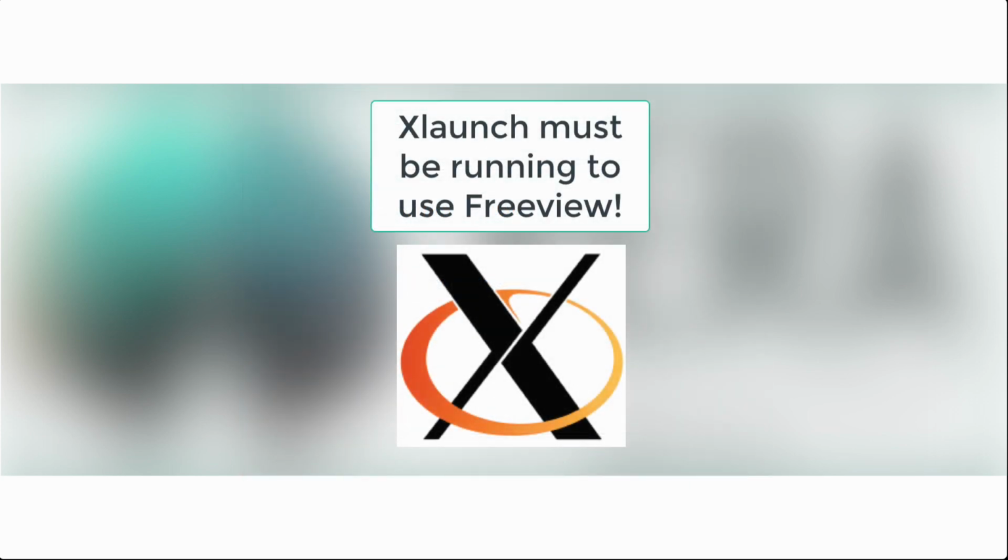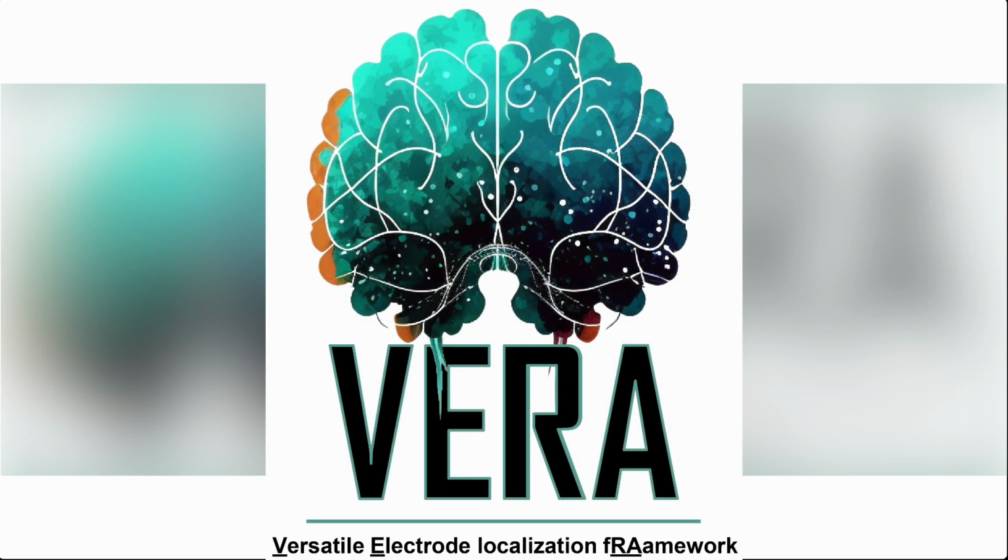Please note that you will need to follow this procedure every time you wish to use FreeView, the graphical user interface of FreeSurfer on Windows. FreeView is used as a core step in our standard VERA processing pipeline, so we will need to start XLaunch every time we wish to use VERA on Windows.